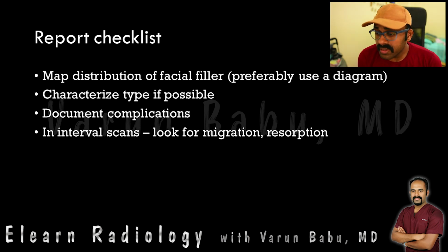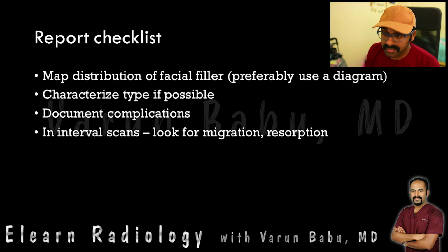So when we are documenting, we should demonstrate, preferably using a diagram, the distribution of the fillers in the 9 compartments, characterize the type if possible, document complications, and if you're doing interval scans, look for migration, resorption.